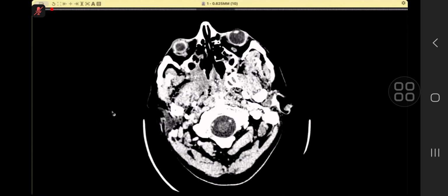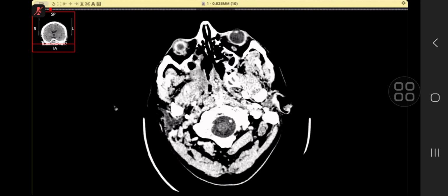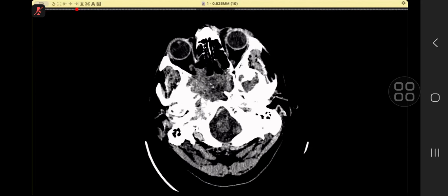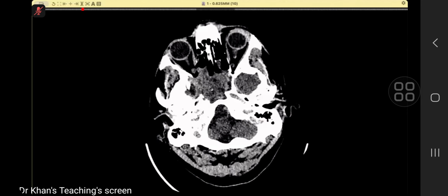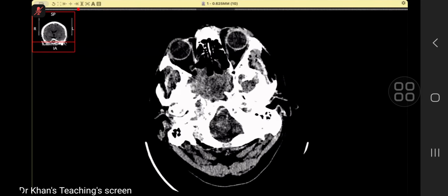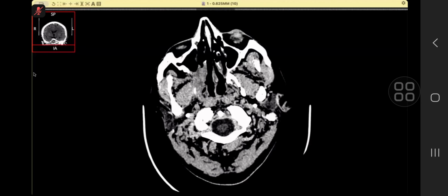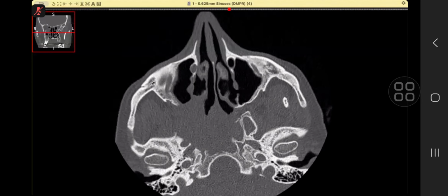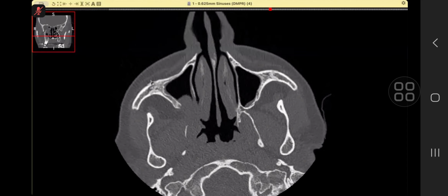Now on post contrast, so this was the post contrast. There was enhancement in it. So I was not interested in that. My whole interest was the epicenter and where the lesion is and what the lesion is doing. So let's go back up here.